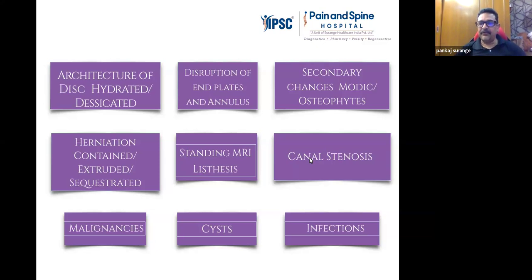Canal stenosis, again, we have to see on MRI what exactly is causing the stenosis. It is not always the disc which causes stenosis. Remember this. Many times we don't even touch the disc. When we do decompression, endoscopic decompression, we don't even touch the disc. Because disc leading to critical stenosis is actually not that common as compared to the flavum and the osteophytes or the facet arthropathies or the listhesis. So all these are the conditions which may cause canal stenosis. So don't just look at the disc.